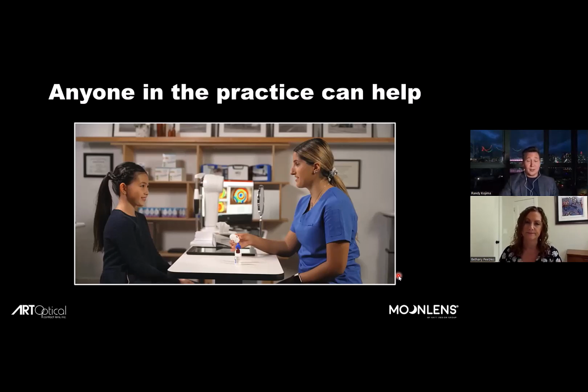Yeah, I was just thinking as you were talking, Bethany, that you're right. If you had the technician taking the topographies post-wear as an example, the doctor comes in and has a look and says, "Yep, smiley face." Just respond to the software smiley face. The technician can be doing that work guided by you as the practitioner. So you could be very involved, or in some practices the technician knows more about orthokeratology practice than the optometrist does, at least from the perspective of using the software platform.